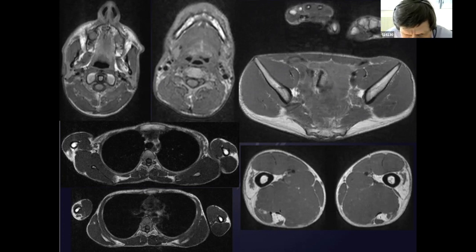We also can perform T2 mapping, which is important in dystrophic changes. For example, in Duchenne dystrophy, to detect the increase or the decrease under treatment of the water content of the muscle, and it's now used for clinical trials.